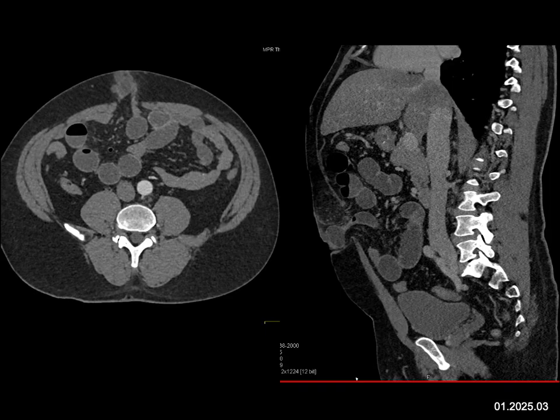Now, when I look at hernias, whether they're umbilical hernias, or peristomal hernias, or inguinal hernias, I always say if I see the bowel and it's thickened, or if I see fluid around the bowel, or if I see inflammation, or if I see all of the above, I would tell the surgeon I'm worried the bowel is ischemic, the patient needs surgery. In this case, you can see the bowel has some fluid around it, there's some stranding. I would have to worry this patient will develop ischemic bowel and this patient needs surgery.